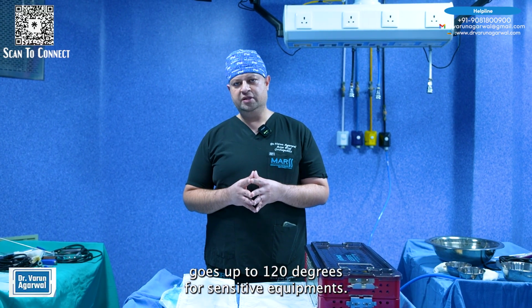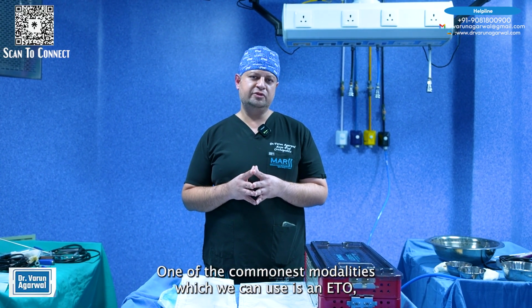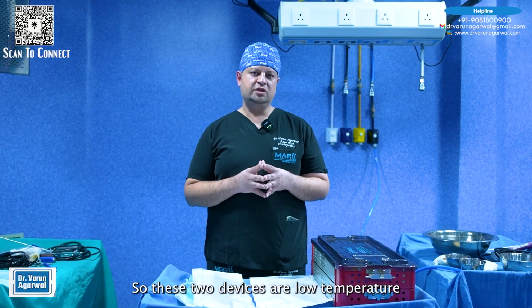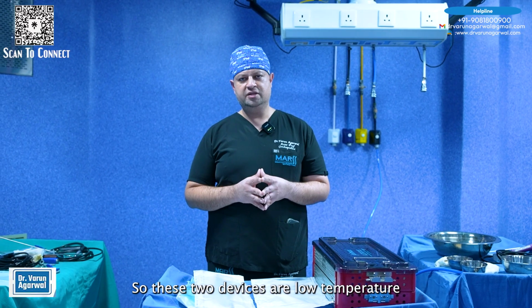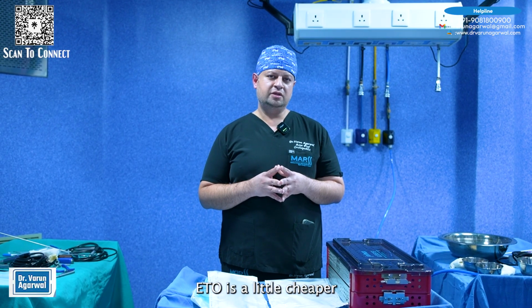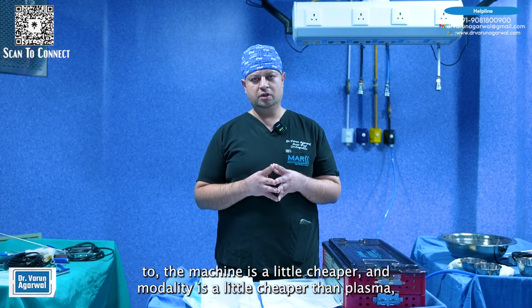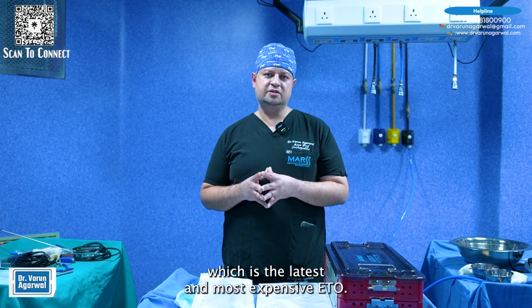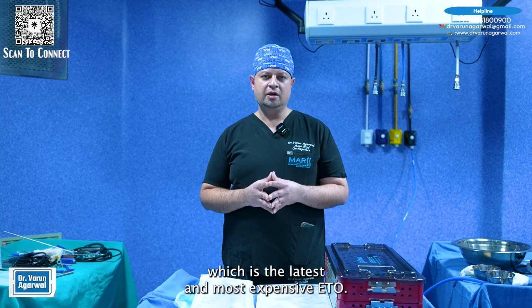For sensitive equipments, one of the commonest modalities which we can use is an ETO, and less commonly, which is now becoming popular, is a plasma. So these two devices are low temperature devices which use gas for sterilization. ETO machine is a little cheaper and the modality is a little cheaper than plasma, which is the latest and most expensive.